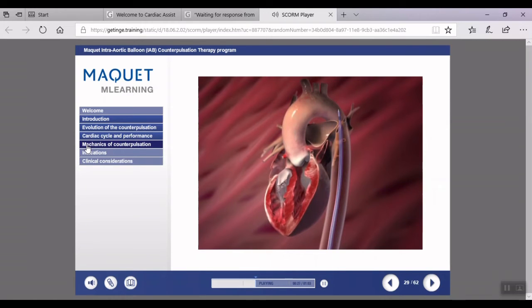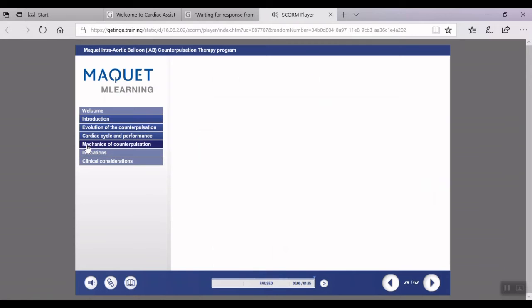The intra-aortic balloon deflates just prior to left ventricular ejection. With rapid deflation of the intra-aortic balloon, the end diastolic pressure in the aorta is reduced. This reduction in pressure decreases the resistance against which the ventricle has to work. Subsequently, the systolic wall tension, or afterload of the ventricle, is also reduced. These effects result in a decrease in myocardial oxygen demand and are reflected by a reduction in aortic end diastolic pressure and the subsequent systolic pressure.